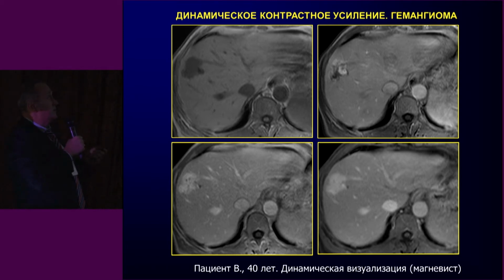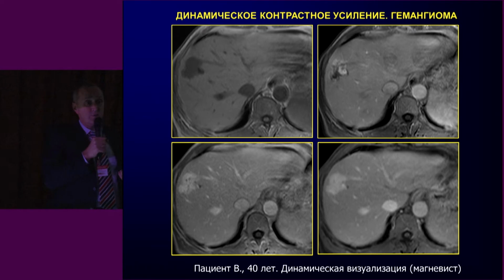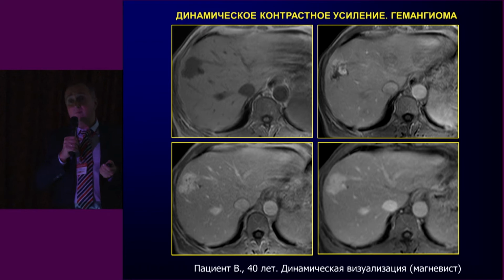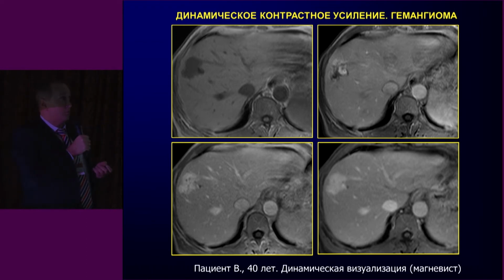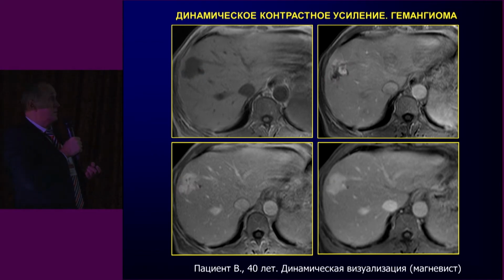A very interesting case. A T1-weighted image of this. This focus looks not quite nice, but the specialist could immediately say that there is a sign of a benign disease, and the contrast accumulation type clearly indicates that it's a benign structure called hemangioma. None of the diagnostic methods, none of the manipulations are necessary. It's a classic picture, classic accumulation, and clear diagnosis.